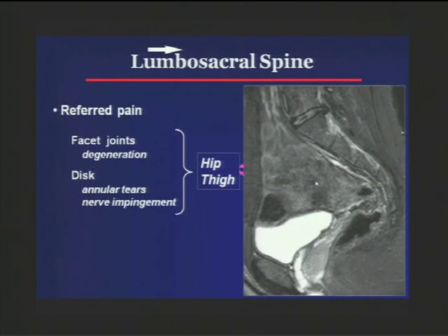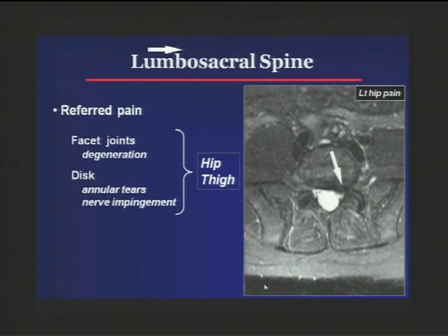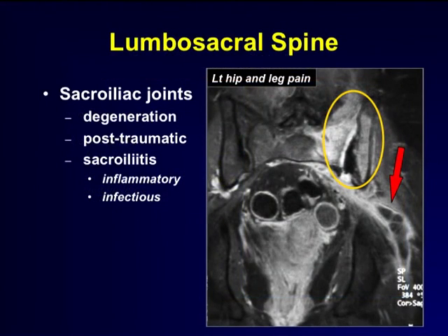The other thing is, when you're looking at a pelvis, remember to look here. This was an athlete who had left hip pain. Didn't see a lot in the pelvis, but noticed something going on here. And luckily, our axial body coil scans got that high, and it was enough to show us the disc protrusion that was slamming the left S1 nerve.